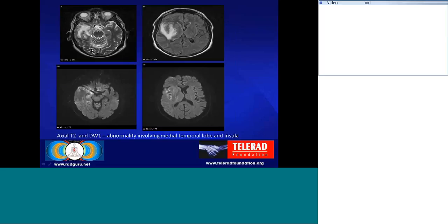So coming to herpes simplex encephalitis, we can see on the axial T2 weighted image that the medial temporal lobe is involved. There is only asymmetrical involvement of the right temporal lobe, and the edema is extending to the insular cortex and frontal operculum.